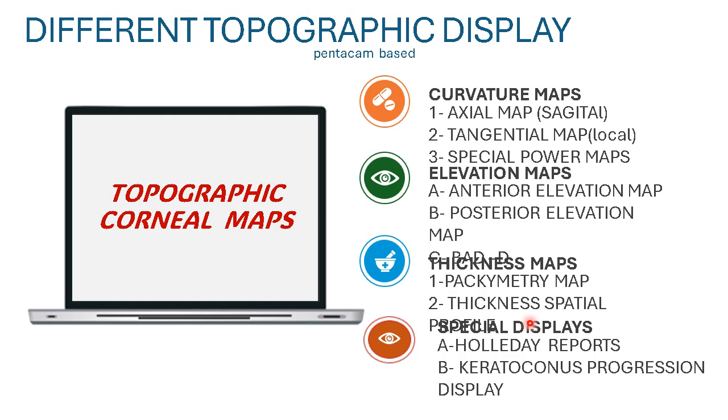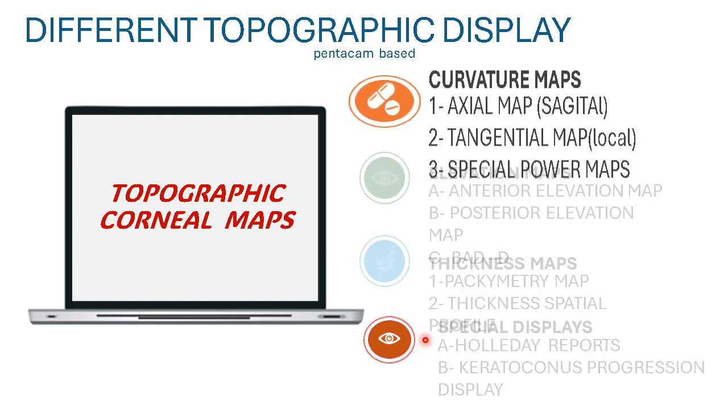The aim of this presentation is not to provide the basics of reading the topography map. I presume that all of you know the basics, but I would like to emphasize and highlight certain important points that I feel are new and should be added to your knowledge for improvement in your understanding of topography. I will start with the curvature map, and then we will progress to the other maps.